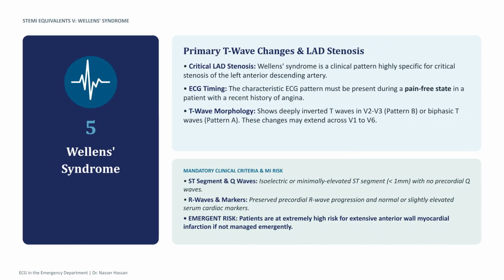Wellens syndrome is highly specific for critical LAD stenosis. Look for deeply inverted or biphasic T waves in leads V2 and V3 during a pain-free state. Patients are at extreme risk for an extensive anterior wall infarction and require emergent management.